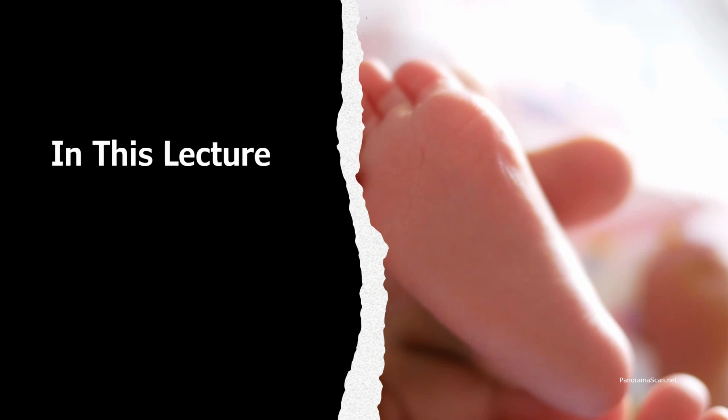In this lecture, we will take a detailed look at the application of 3D and 4D ultrasound in detecting fetal anomalies across various systems. By the end of this session, we will have a solid understanding of how volumetric imaging aids in evaluating fetal head and neck anomalies. This category includes craniofacial abnormalities and conditions affecting the central nervous system.